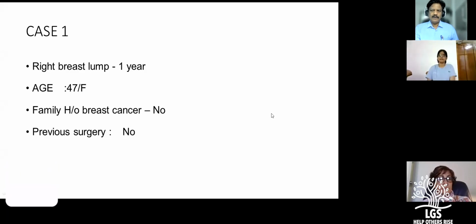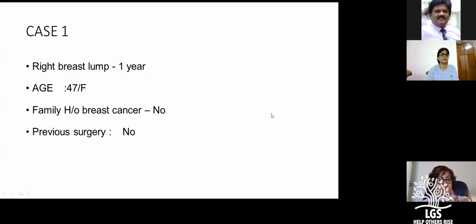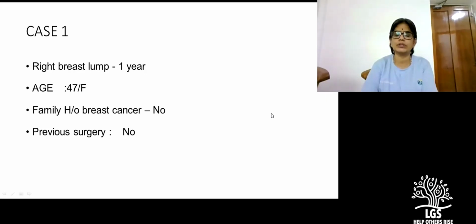So we did look at some basics of breast imaging last week. We looked at how to assess the adequacy of a mammogram, positioning particularly. And we also talked a little about breast density and quadrant localization.